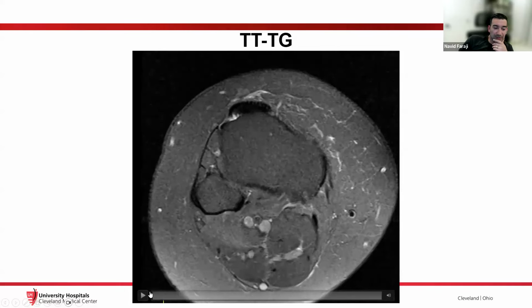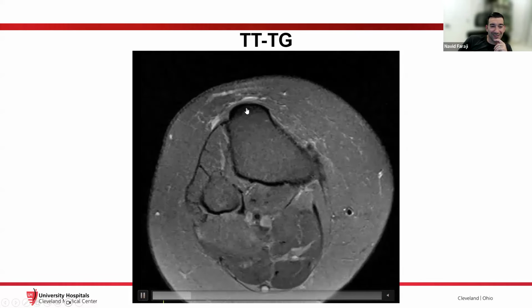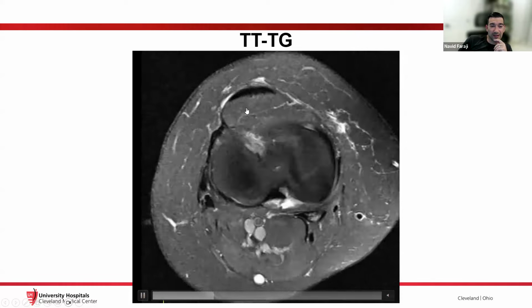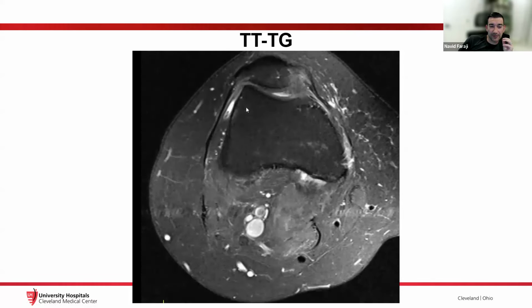The last couple things I want to talk about in the setting of a transient lateral patellar dislocation is something we measure called the tibial tuberosity to trochlear groove distance. Basically, in an axial image, we find our tibial tubercle where the patellar tendon inserts or attaches, and then we want to measure the distance in the transverse plane of that area to the central aspect of the femoral trochlea. And this is just a very cursory way of doing it.